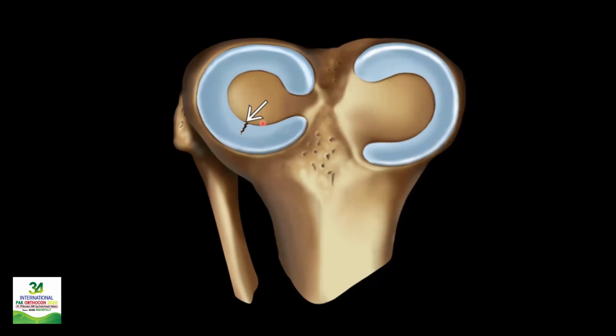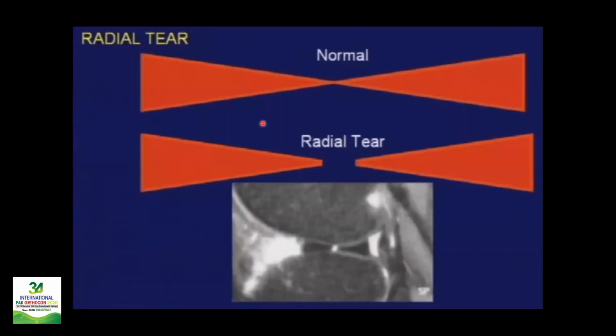to be repaired by themselves. One more finding you see in the radial tear is that instead of having a smooth tapering along the medial edges or the inner edges, you can have an abrupt cutoff of the free edge of the meniscus. You can appreciate the same finding on this MRI image, where instead of a smooth tapering, you can have an immediate defect sitting in between the free edges.